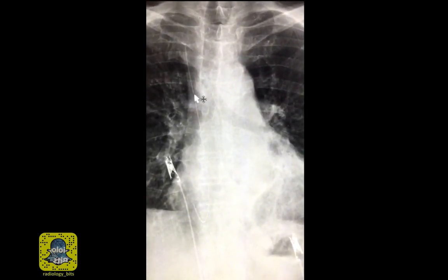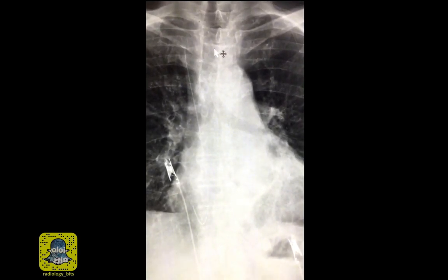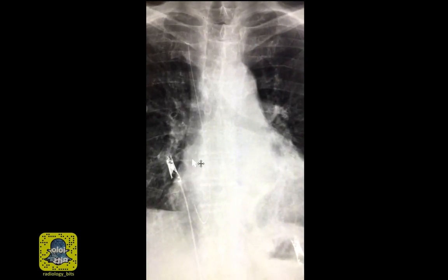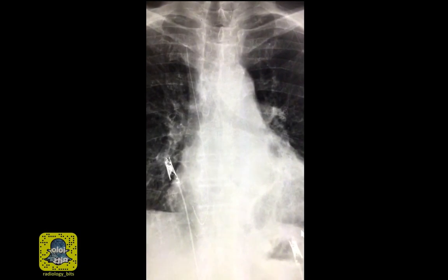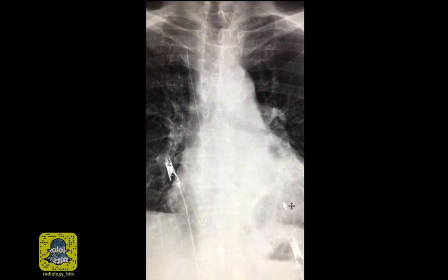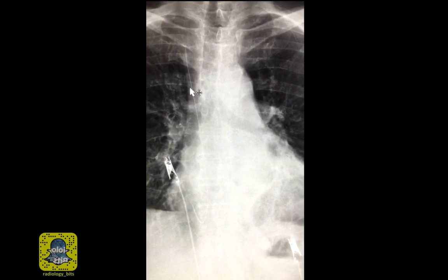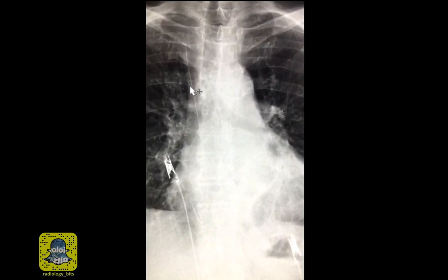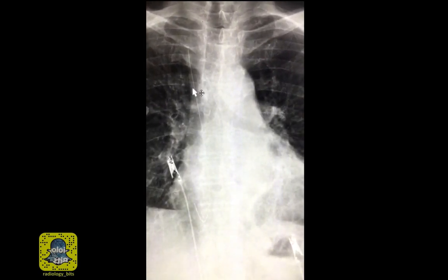For junior audience, this is not an endotracheal tube. An endotracheal tube should run within the trachea, and it looks totally different. It is not a pleural drainage tube. These are usually larger and look different and have a course that runs from lateral to central. This is not how surgical material should appear. The patient did not have surgeries anyways. And the question remains, what is this?